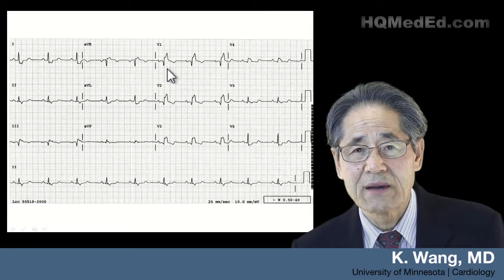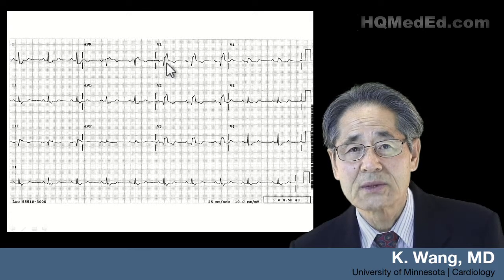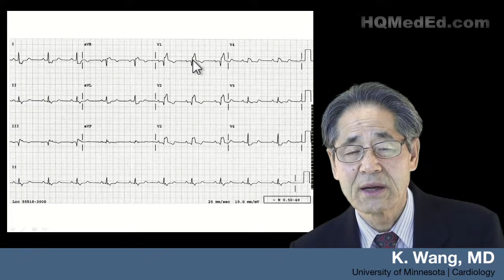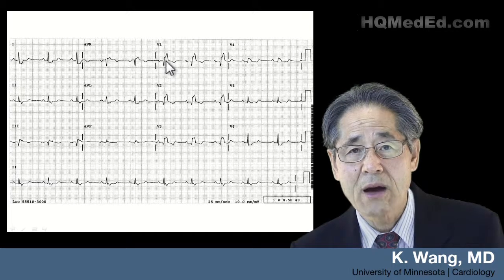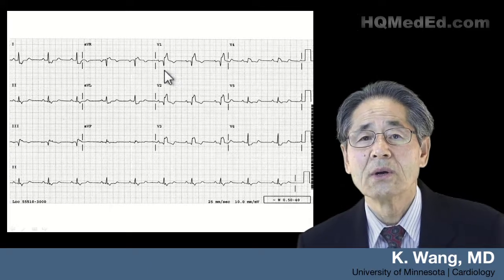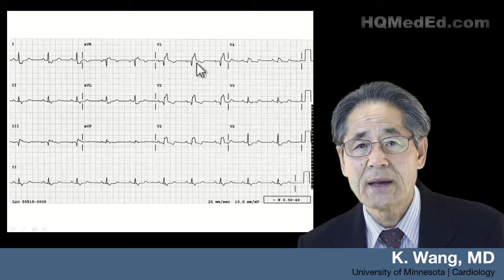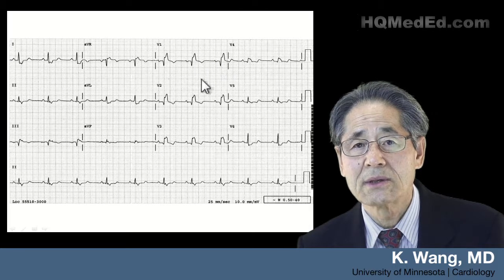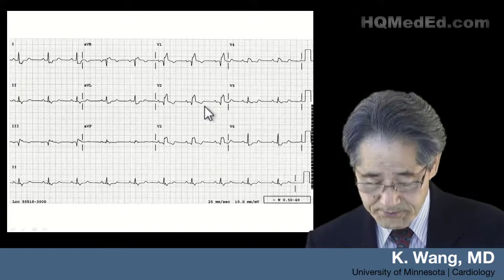This is not ST elevation at all. ST segment actually begins here. But this was misinterpreted as Q, then ST elevation, ST elevation. This is a broad S wave, broad R prime in a patient with Ebstein's anomaly. So beware. Something may look like ST elevation, but actually the ST segment begins here, there, or there. From here to here is all QRS.